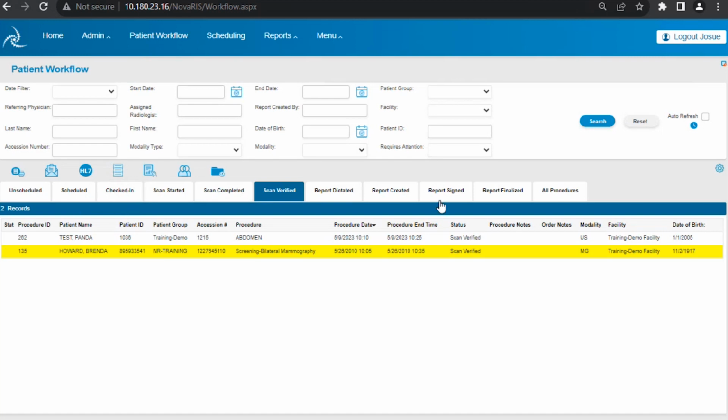So even when you have all the different statuses, you don't have to move all your patients through every single step. Since the screen is optional, you will tag only those patients, and your staff most likely will know they have to make sure that patient follows the instructions prior to coming on site. And when the patient is on site, they will have to follow up for the rest of the preparation. If it's going to be drinking, well, give them enough water. They also have to give them the contrast to drink and make sure that they have waited the correct time so that they will be ready to be called in and take the study.